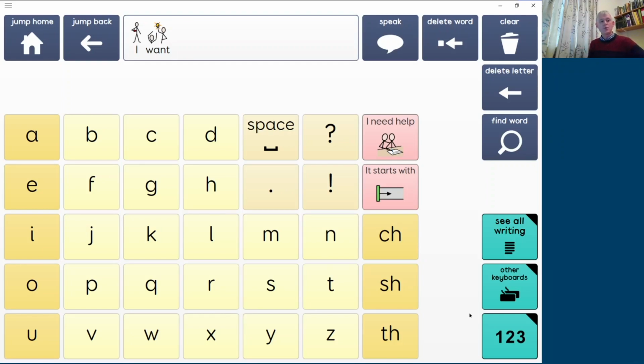So that's called two-way elimination. 4-way elimination, if you can manage 4 switches, can be even more efficient because, again, with a big grid set, it's always the same number of selections. You're not having to wait a long time to travel across a big grid set.